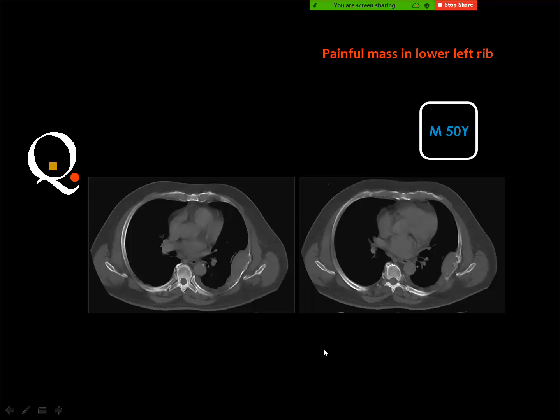Do you remember the rule that I have made many times ago, that if you see a lesion and you don't know the differential diagnosis of this lesion, and you feel that it is of malignant nature, then you mention the primary malignancies that could be here, then you mention immediately after it lymphoma, and then metastatic deposit. These are the most frequent three lesions coming after each other.